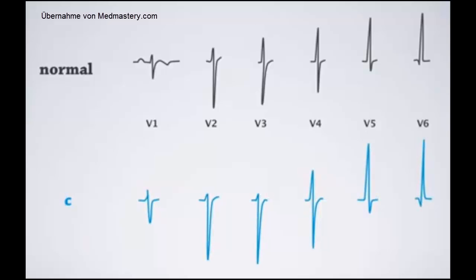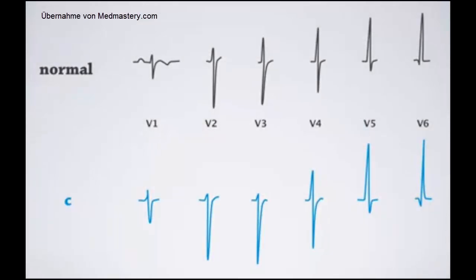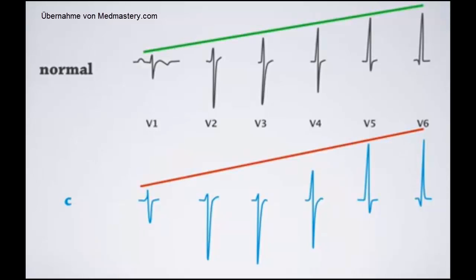What's the problem in example C? Again, pause the video and think about it on your own, then come back and restart the lecture. Pause the video now. The problem in this example is very similar to the previous one, just a little more subtle.